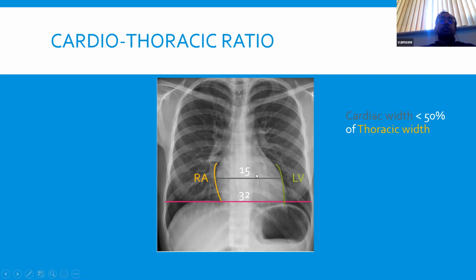And this is important because it's an important sign in heart failure, because in advanced heart disease, you end up with dilatation of the muscle because it's trying to compensate for all sorts of causes of weakness, maybe previous infarct, etc. It could even be congenital, and that results in cardiomegaly. That's important because if you're likely to have heart failure, that could have lots of prognostic indications when it comes to surgery, etc. It also could explain some of the signs you see, such as pulmonary edema and so on. We'll go through that in a bit more detail later.